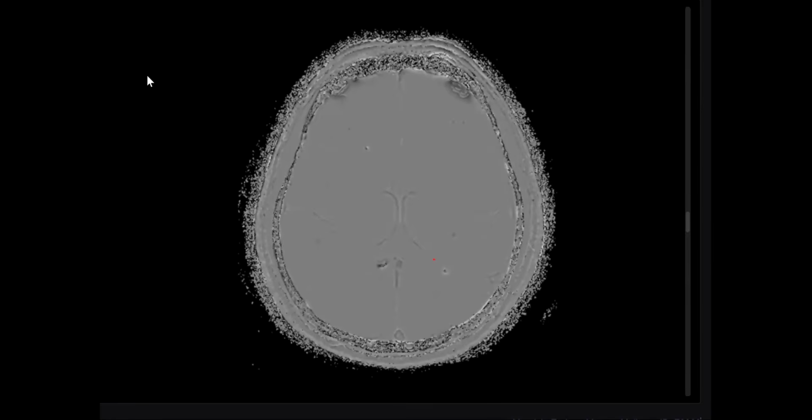According to the machine, we have right-sided machines, like GE, and left-sided machines, like Siemens, so the signal will be the opposite. Amyloid prefers the periphery. Hypertensive prefers the center. So amyloid is subcortical, lobar mainly, and hypertensive is basal ganglia mainly.